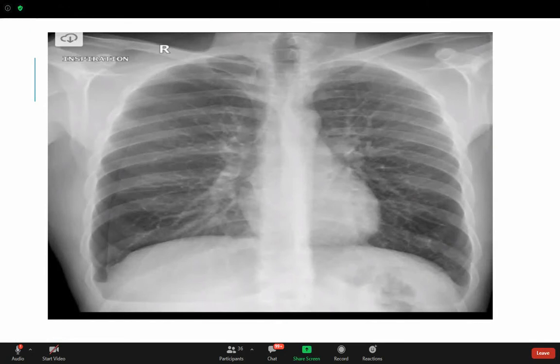Okay, so sometimes a technician is not planning to do a perfect or medium exposure. They may sometimes give overexposure because a doctor asked them to, to try to identify a pneumothorax more clearly in the chest X-ray. Okay.